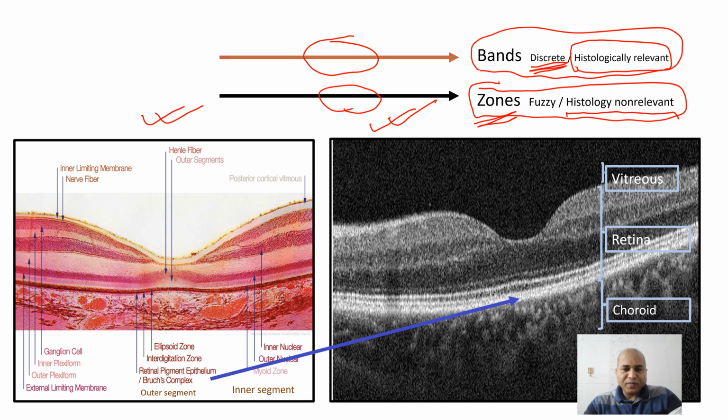Now this is the outermost layer which is most reflective in the neurosensory and retinal pigment epithelium, and we have also labeled these gross layers as choroid here, and then we have retina which extends from this portion to this portion, and this is choroid, and outer to this we'll have sclera, and this portion which is clear is vitreous. So what we are going to study is this structure extending from this inner aspect up to this outer aspect.